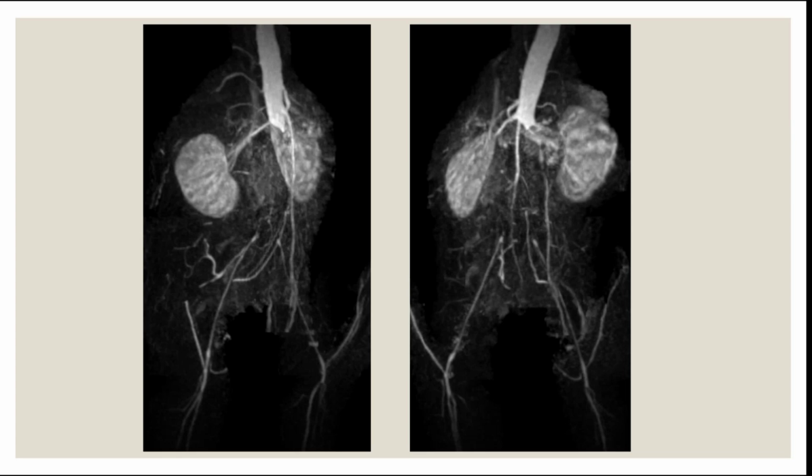And it is a total occlusion, not even partial. So there is no blood, no contrast flowing. It is stopping at the level of the kidneys. We can't see the common iliac arteries. We can't see any arteries from below. I can't see the celiac trunk, but you can see the superior mesenteric artery going down. Okay?